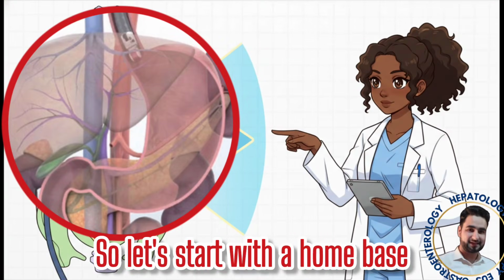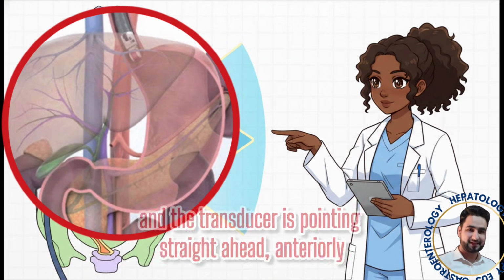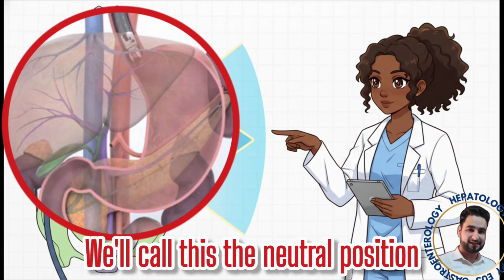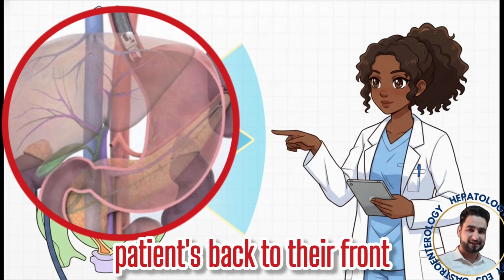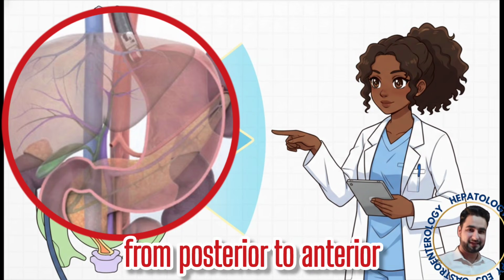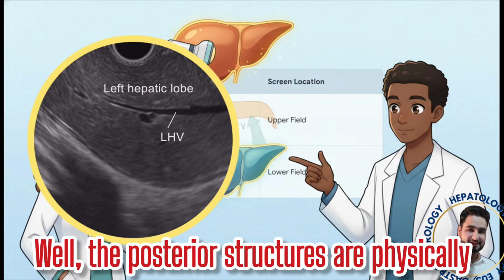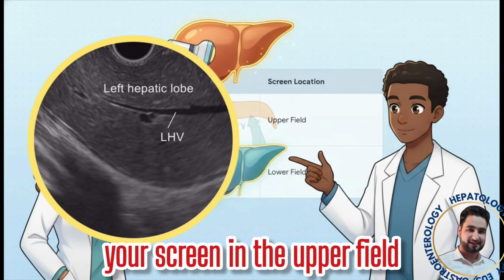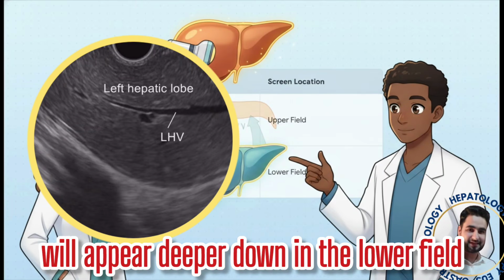So let's start with a home base. Picture this. Your scope is at the GE junction, and the transducer is pointing straight ahead, anteriorly. We'll call this the neutral position. Your sound waves are now traveling from the patient's back to their front, from posterior to anterior. What does that mean for your image? Well, the posterior structures are physically closer to the probe, so they're going to be right at the top of your screen in the upper field. And the anterior structures, which are further away, will appear deeper, down in the lower field.